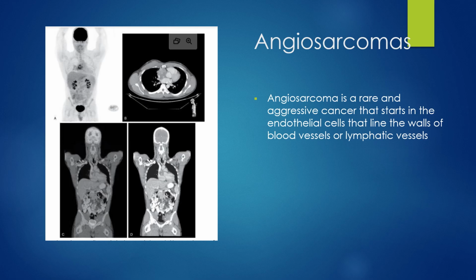The patient here on the left has an angiosarcoma and got a PET CT study. It's arising in the pericardium and involving the right atrium of the heart. So you actually can see it, small picture, and I'm sorry about that, but you can kind of see it right here in the CT and the PET study.